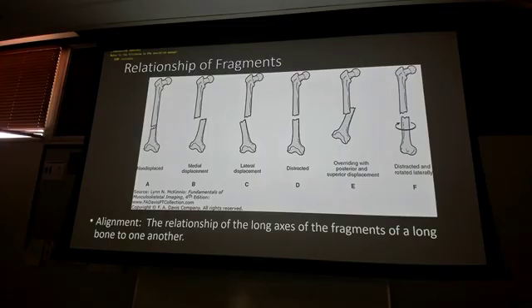Delta, don't get too hung up on that. I don't need you to really just know that distracted means it's being pulled apart. It's pretty rare, because when something like a femur breaks like this, because of all the muscles, it usually ends up overlapping. It doesn't usually stay distracted, but that is a definition that's in the book, so we got that in there. And yes, you can technically name, look at all the words you could use, overriding with posterior and superior displacement.